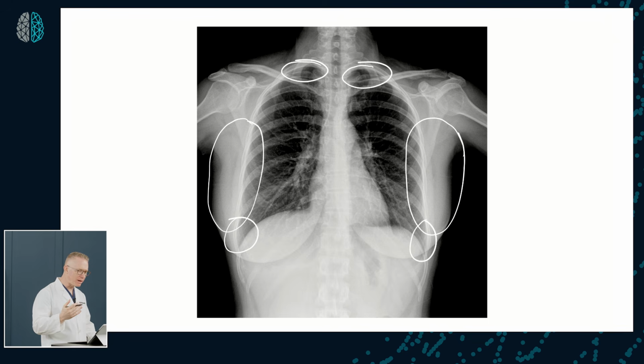Now, the scapula should be rotated off the fields, especially if that is a PA view. Remember, they're wrapping their shoulders around, which pulls the scapula around the rib cage and out of the way. So why does some of this stuff matter? Well, because with clipped views of the apices, you're going to potentially miss a small pneumothorax. What about clipped or missing portions of the costophrenic angles? Well, you're going to miss potential effusions, pulmonary edema, basal pathology that may also represent some opacities.